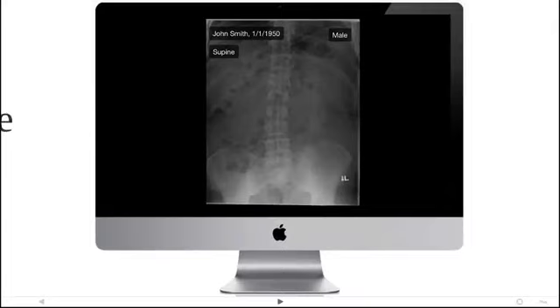Commenting on all of these things will also give you more time to actually look at the film and assess what you think the most clear pathology is. In the context of exams, this can be very useful, as you will be giving the examiner some information without actually telling them anything that you have to look for.